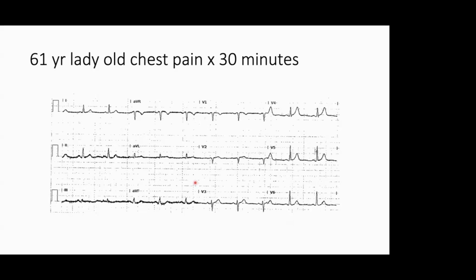That is one. When you look at this ECG, you have to find 4 or 5 things. One is Q waves, the development of Q waves. Q waves can develop from 1 hour to 12 hours, so they can develop as early as 1 hour. Then QRS height: from V3 to V4, and V5 also, there is loss of R wave height.